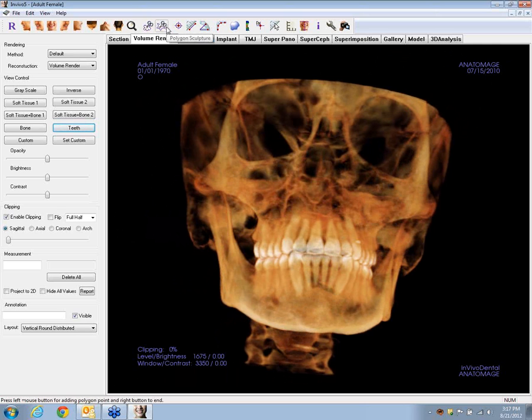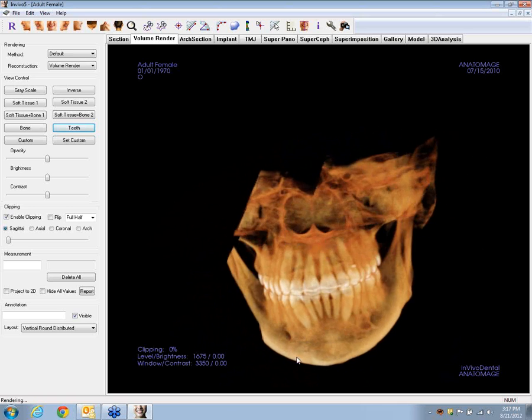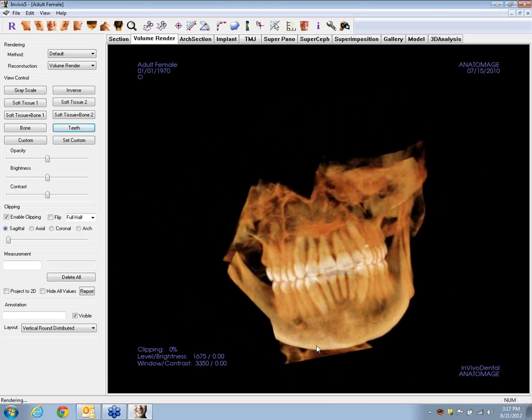The other sculpt tool here is called the Polygon Sculpt, and this makes, as you click out points, straight lines. So we can use straight lines to make our cut. To stop creating points here and to get the use of our scissors tool, all you need to do is right click or double click, and then our scissors tool is freed up and we can make our cut. All right, this makes very clean, nice, sharp razor cuts here.